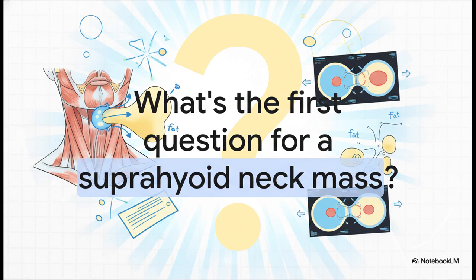So what's the big takeaway here? It means you now have a rock-solid framework. Instead of getting overwhelmed by a neck mass, you can walk up to it with confidence. The next time you see one of these deep neck masses, you know exactly what to do. The very first question you ask yourself is, which way is the fat being pushed?